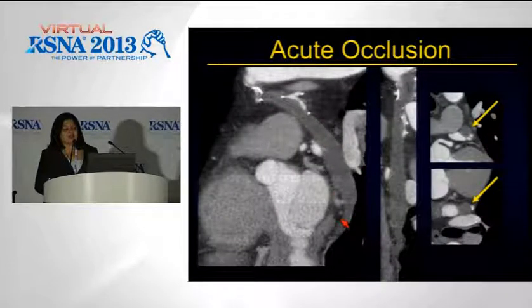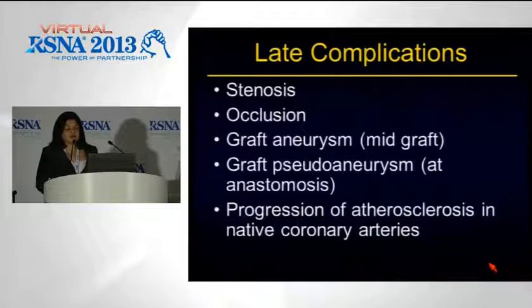And here is a patient who came to us from an outside institute, had a PE scan to rule out PE because of chest pain, and they didn't have any pulmonary emboli, but on their PE scan, which were thick sections, you could see a tubular sort of structure, and it was a graft. And they did this bypass graft CT evaluation, and what we saw was an acutely thrombosed graft dilated with thrombus, and this patient basically had just suddenly thrombosed his saphenous venous graft.